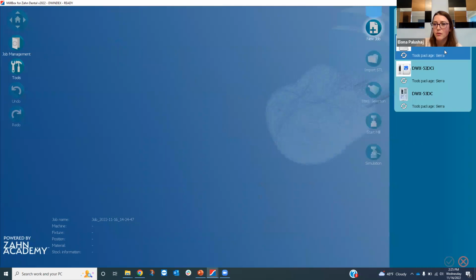All right, so now if I go to create a new job, so it's back here.